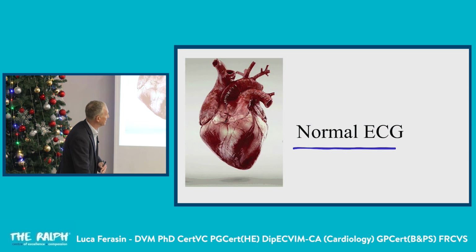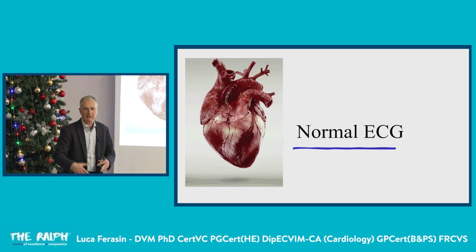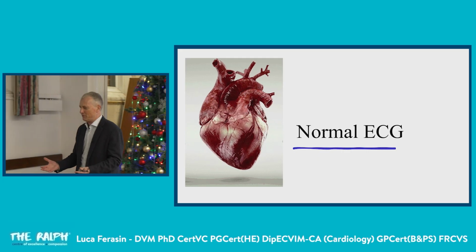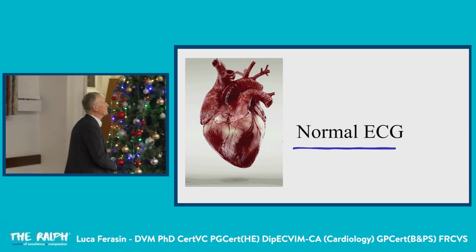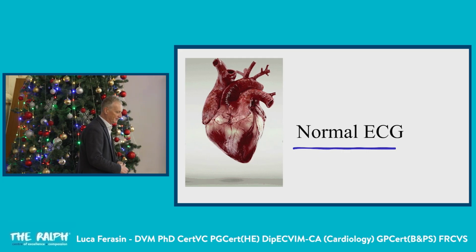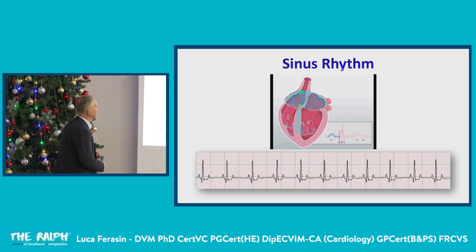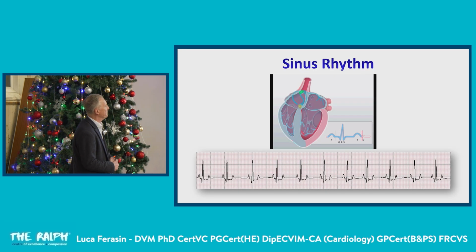Let's start talking about the normal ECG. Obviously, you are familiar with ECG because if you have an ECG machine, you do at least one ECG per month. So let's look at what is normal, and then from there, we can see what is abnormal by comparing.